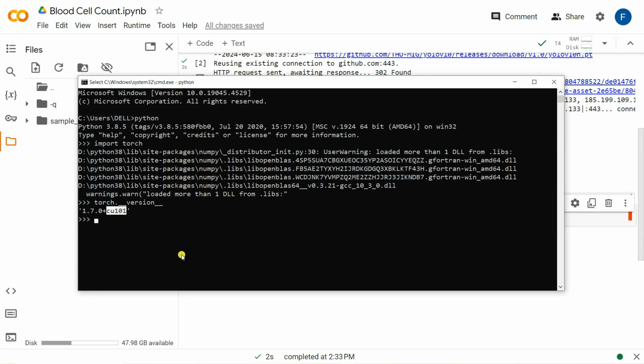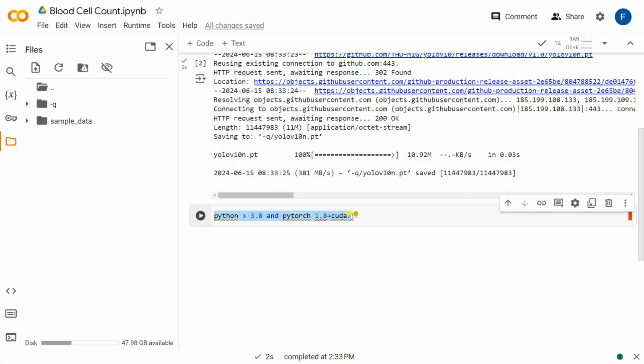Am I using NVIDIA? Okay, and a Core i5 laptop. So that's why it's not supported in my case. So that's why I'm choosing the Google Colab one. Okay, well, now what I can do, I'm simply going to download the dataset.